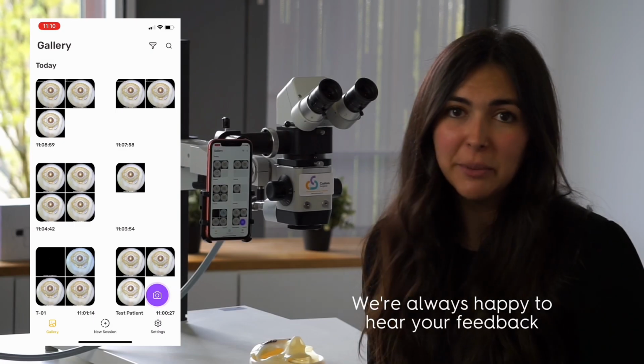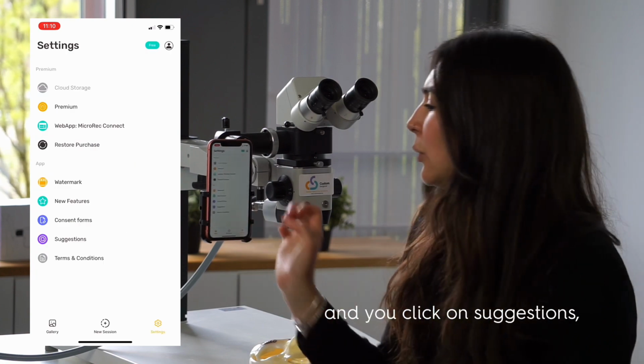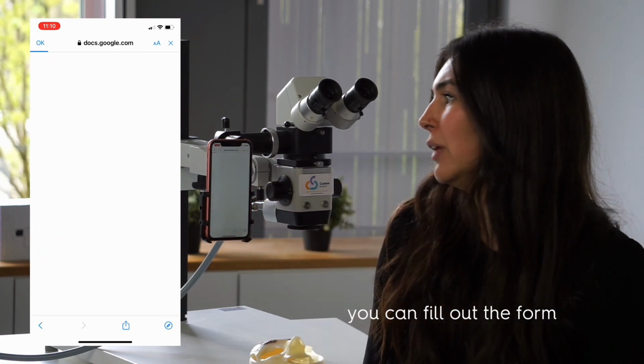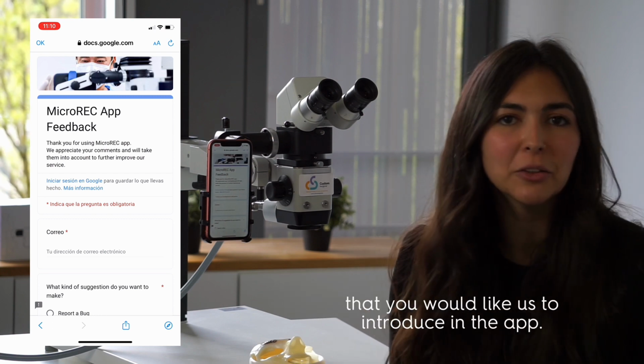We're always happy to hear your feedback and your suggestions. So if you go back to settings and you click on suggestions, basically you can fill out the form and let us know about any bugs, any new features, or any cool thing that you would like us to introduce.